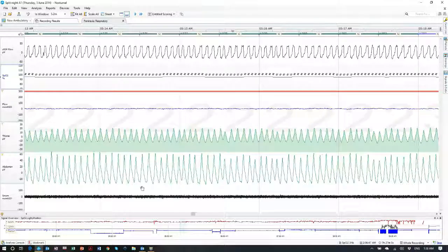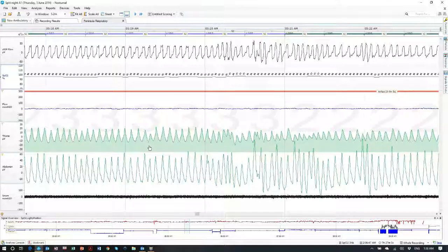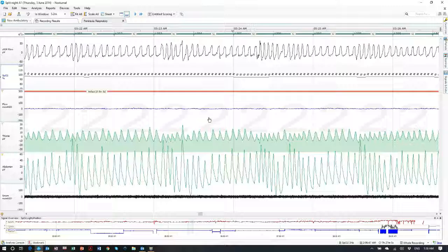So there we go. We've just filled the plot on that one, and sometimes you can make them look rather pretty with different colors, but more importantly, it enables you to set these things up exactly the way you want. You can set up the background the way you want, in that slightly off-white yellow if you wanted to. If it's displayed in exactly the way you're used to seeing it, then there's far less adjustment that has to happen when you adjust to this software, and you can go ahead and score very quickly. Scoring is very easy.